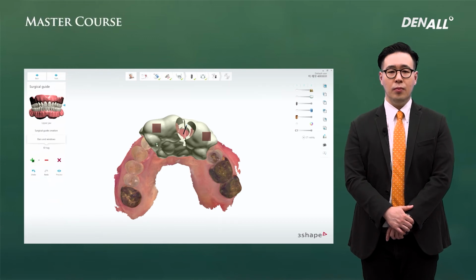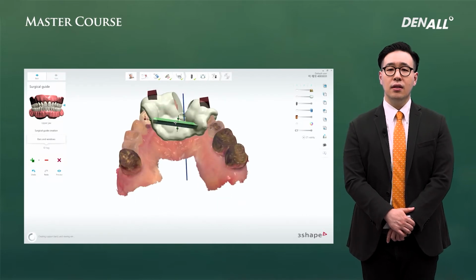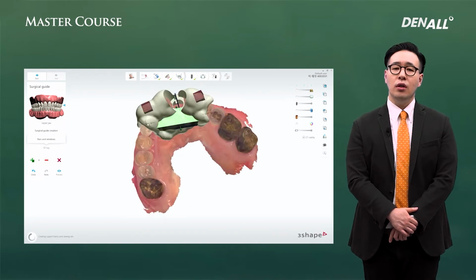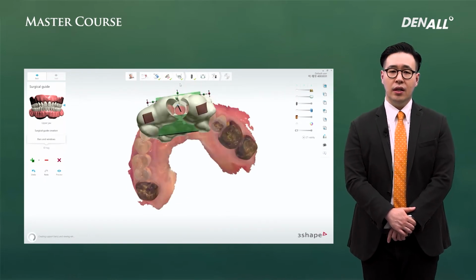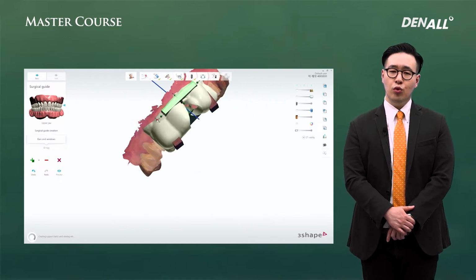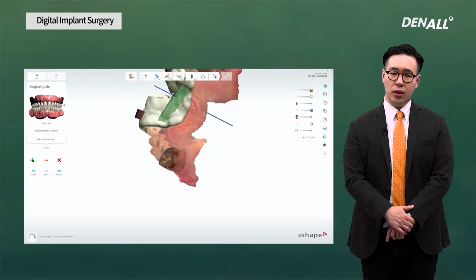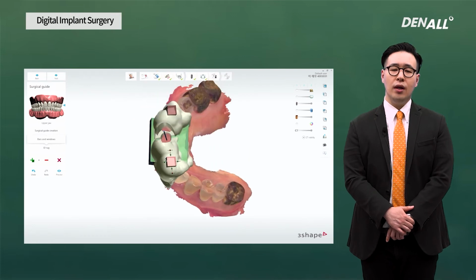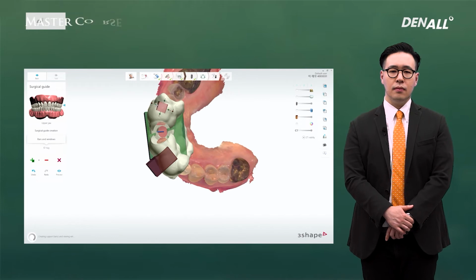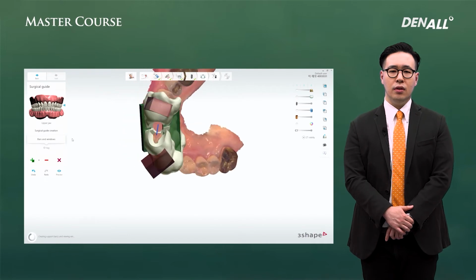As you can see, the three-dimensional guide appearance is preliminarily completed and displayed on the screen. After that, if necessary, a support bar surrounding the guide hole, and at the guide hole, a mesial-distal viewing window can be created, through which fitting of the guide and tissue surface is checked during surgery. A window is made and its size is adjusted.